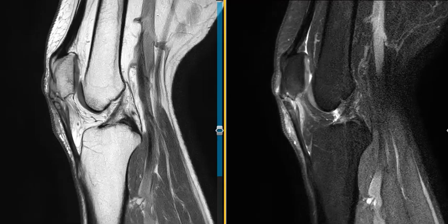Hello, this is Dr. Gay from First Look MRI, and this is a 44-year-old gentleman who complains of anterior knee pain for about 27 years. It began when he was around 11 years old and continues to this day.